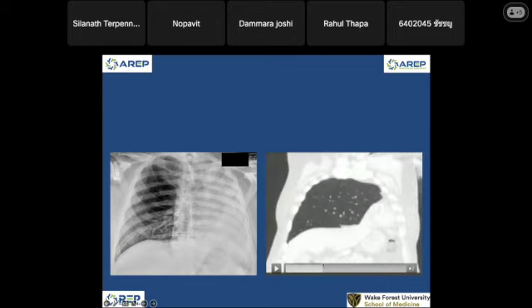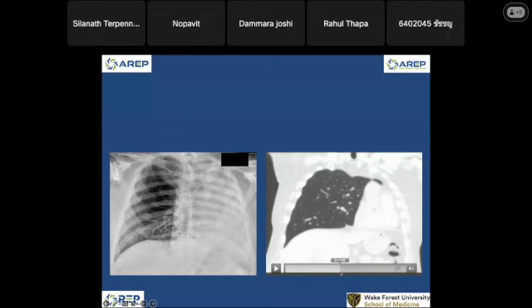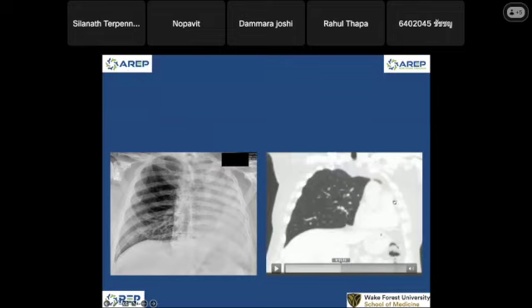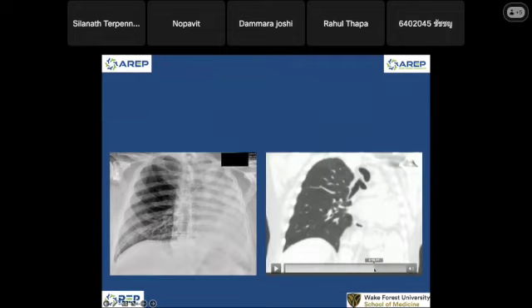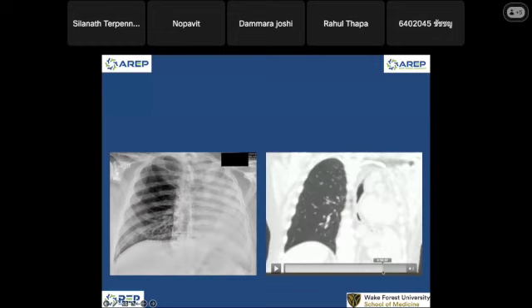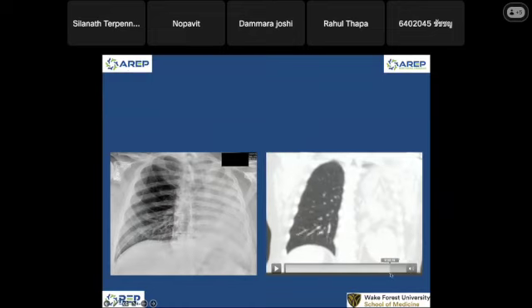So look at this. This is my midline, and the right lung crosses the midline and then goes to the left. And then this is my aorta. This is the heart shadow. Okay, and we don't see left lung. Okay, let's look at the airways. This is our trachea. This is our carina, and we're going to focus on the left lung. It's gone. The left main bronchus is cut off, and everything is gone.